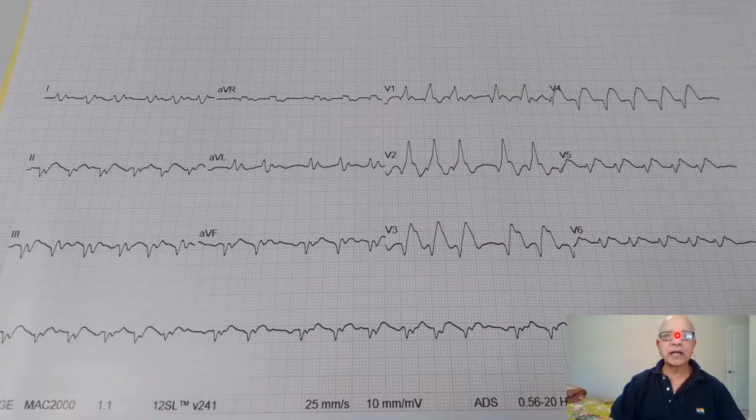One, what is the diagnosis in this 12-lead ECG? And second, what is the irregularity in the ECG which you see? The irregularity seen here, what is it due to? So you can start off. I'll give you about 2.5 to 3 minutes for the discussion.